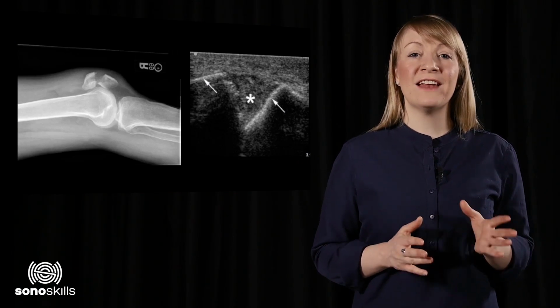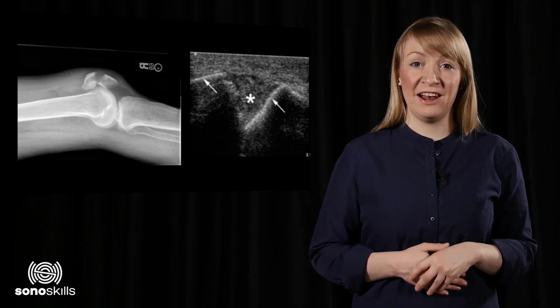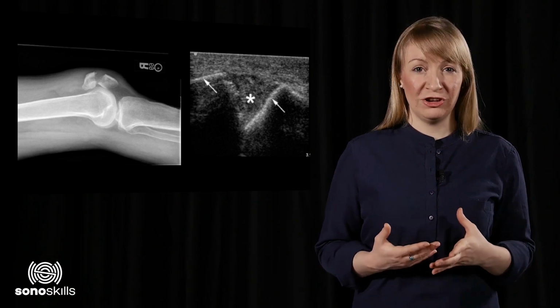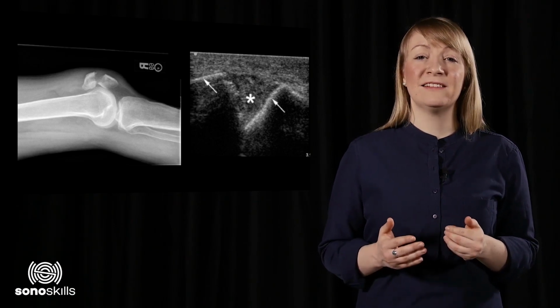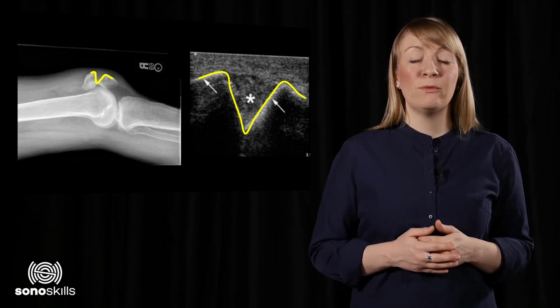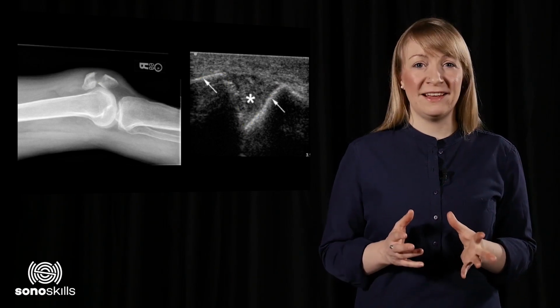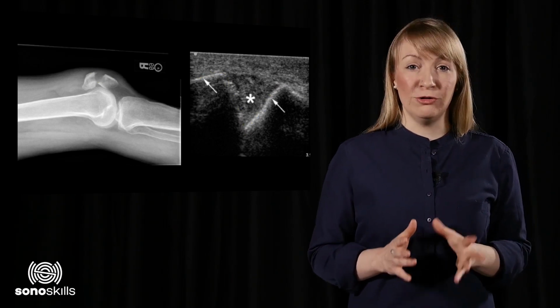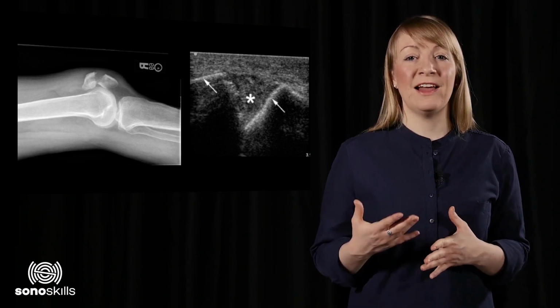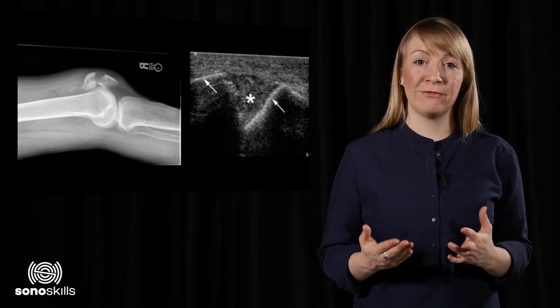The left image is an X-ray of the patella. The right image shows a longitudinal ultrasound scan of the patella. We know that ultrasound is not the golden standard for assessment of bony tissue. Still, in some cases, it's evident that the bone is fractured, like in this case, where a clear disruption of bony tissue can be seen. Based on this static image, it cannot be confirmed whether there is a functional problem. We can assume, based on previous findings, that this patient shows a patellar fracture. An X-ray has to be made to assess the full scope of the fracture.